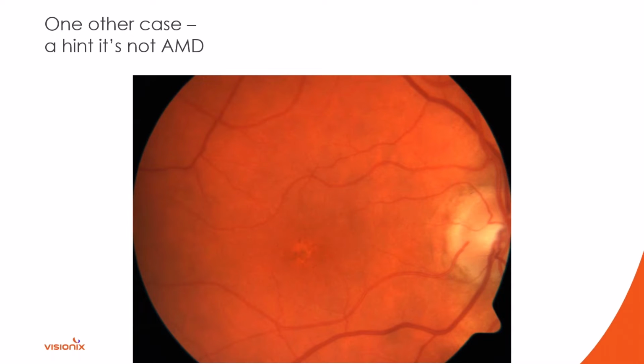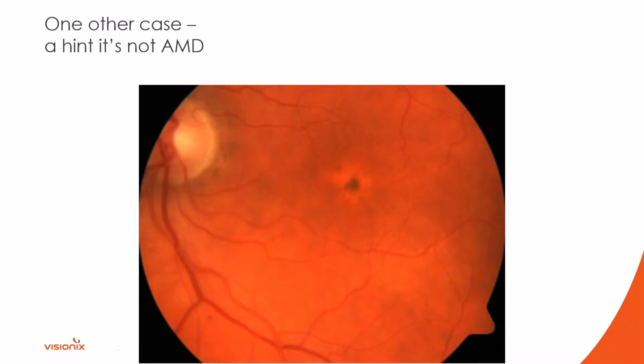This was a patient in their late 60s. And you take a look, we've got some pigmentary changes in the macula, as you can see right here in the right eye, and the back of the left eye looked similar as well. So okay, late 60s, we've got some pigment changes. Is this macular degeneration? Vision was between 20/25 and 20/30, so it's not terrible. We got a mild cataract, so maybe that's partially responsible for the 20/25 to 20/30 vision.